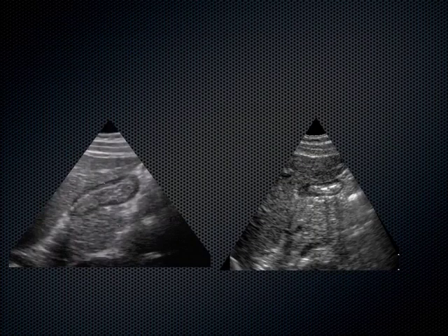Okay, now, for those of you looking at your iPads who can see the lecture and the answer, don't shout out just yet. Look at this image here and tell me what organ you think you're looking at. It looks like a gallbladder, right? It looks like a gallbladder filled with sludge or something, but it's not. Remember when I told you that this organ looks like this all the way from the esophagus down to the rectum?